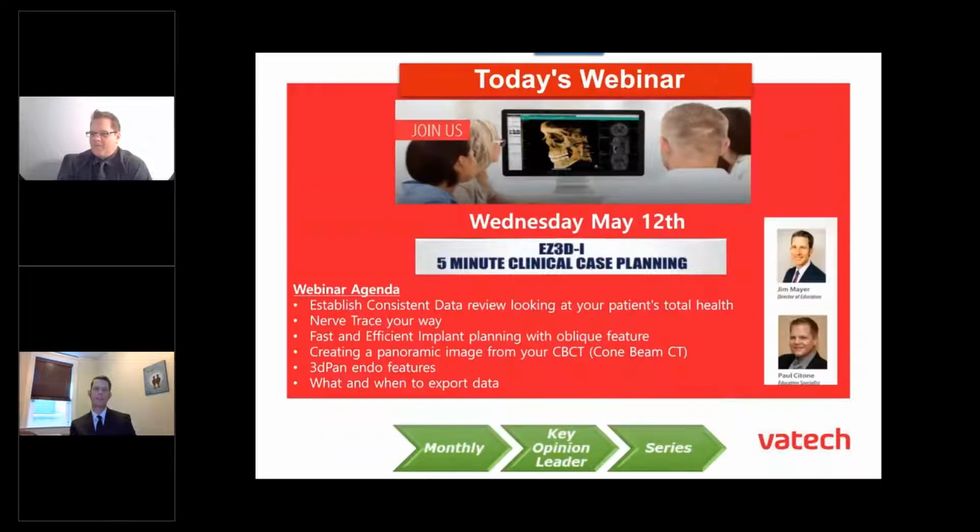I think we've got a lot of cool things planned this evening for our session, and we're calling it 5-minute clinical case planning. Right. And I think we're trying to just talk about looking at a scan from the overall patient's total dental health. How do we plan for this?